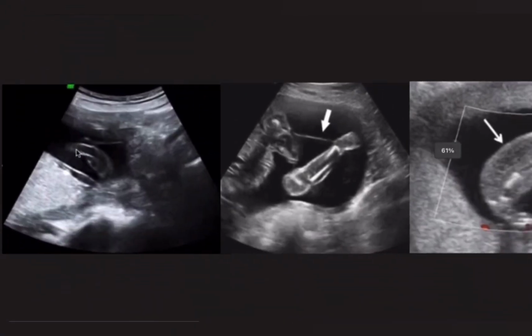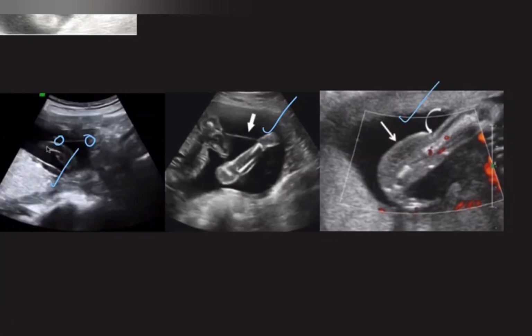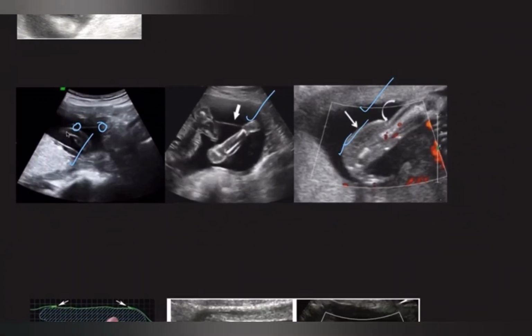Another differential of intrauterine linear echogenicities is the amniotic bands. Why do they form? Because of the rupture of amnion. They can be multiple in number. How to identify them? They attach the uterus to the fetal parts. Remember, it's not uterus to uterus. It's always from the uterus to any of the fetal parts, whether it be the umbilical cord or fetal limbs. See, in this case, due to attachment to the fetal limb, it has caused a constriction band and marked edema of the distal limb. As they are formed just of amnion, they are very thin in thickness, and they cause many fetal malformations.